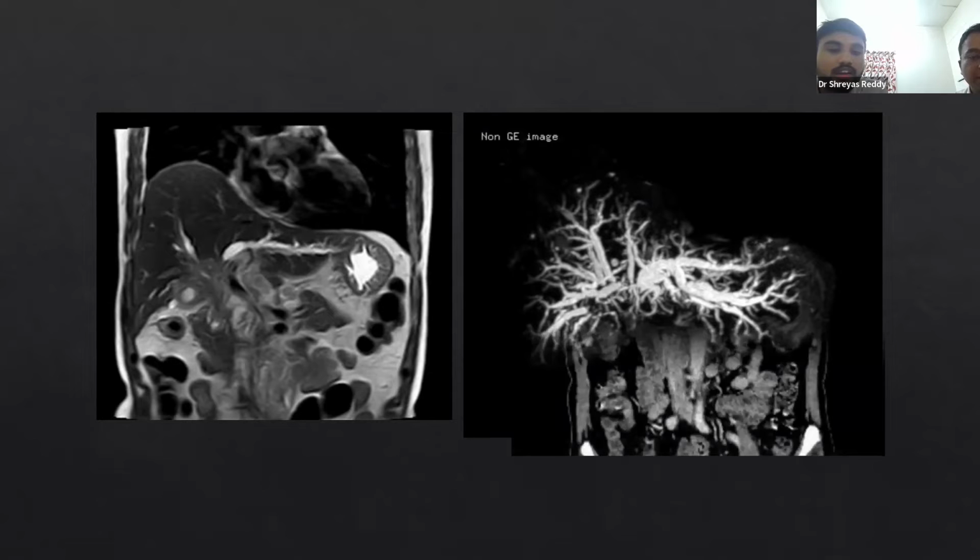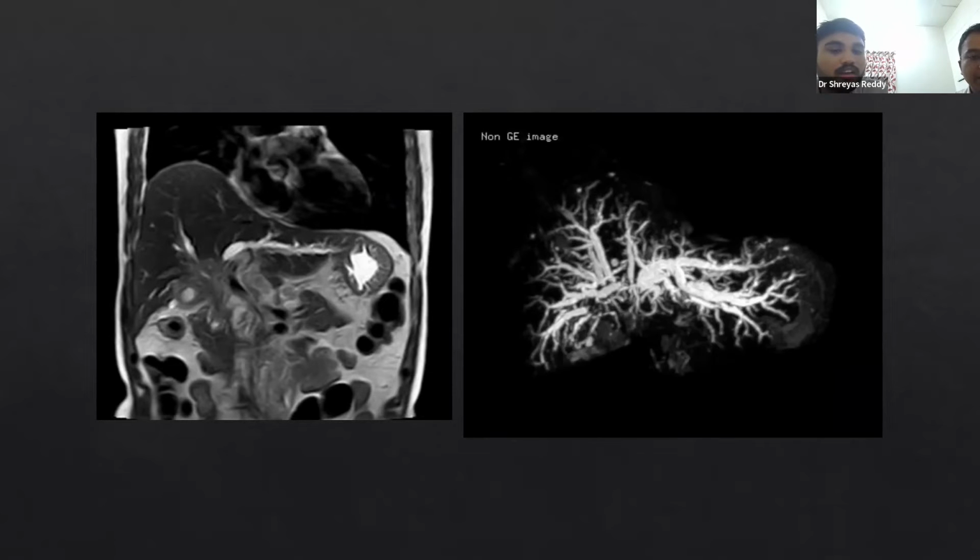What do you see in the MRCP? How do you review an MRCP image? Is there something peculiar about this case? What do you see in the MRCP, that heavily T2-weighted image? You see the isolation of the ducts. What is isolation? Isolation is when all the ducts are segregated because of the mass. They are separated. There is no joining place.